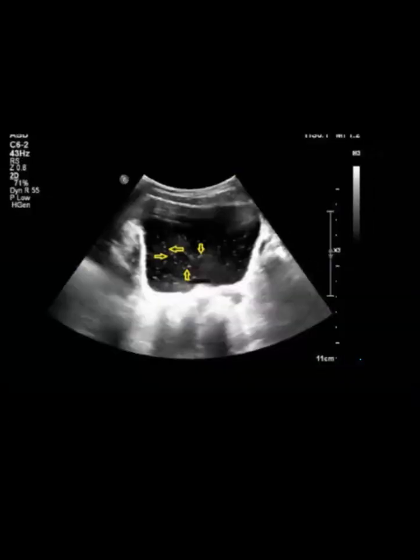Here the bladder is slowly getting calcified. This is infection with some parasite. Can you name that parasite? Schistosomiasis. Yes, finally it will lead to calcification. Schistosoma haematobium.